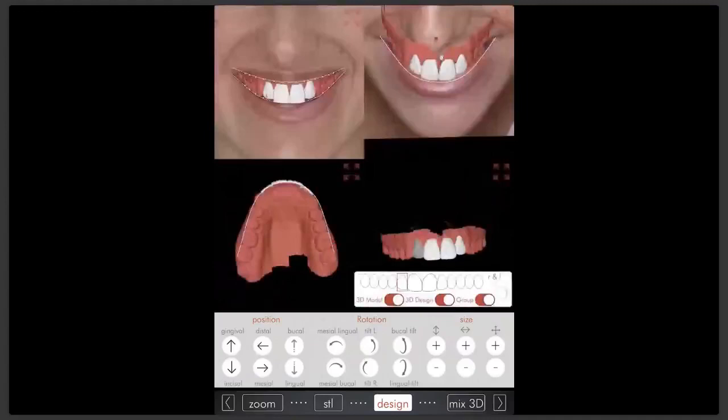This is what I wanted to design for this patient. Always keep in mind that if we are doing a mock-up for only 4 teeth, we need to match the color really well, and maybe the perception of the patient is not going to be that powerful as when we do all the teeth. I just wanted to show you fewer teeth and more detailed, but of course you can do a full mouth very easily. Something else we can do is mix the shapes.